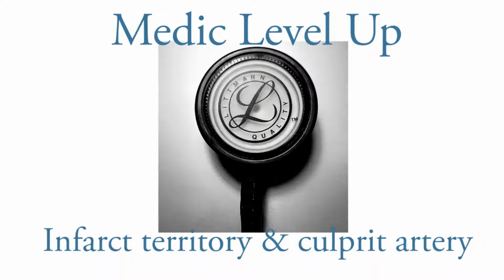Today's video is going to be about infarct territory and identifying the culprit artery. So we'll start off with a simple fact that we've discussed in the previous videos. It's that the 2, 3, AVF are the leads that are looking at the inferior aspect of the heart, as shown in this image. So the 2, 3, AVF are the inferior leads, and they show an infarct in the inferior territory.